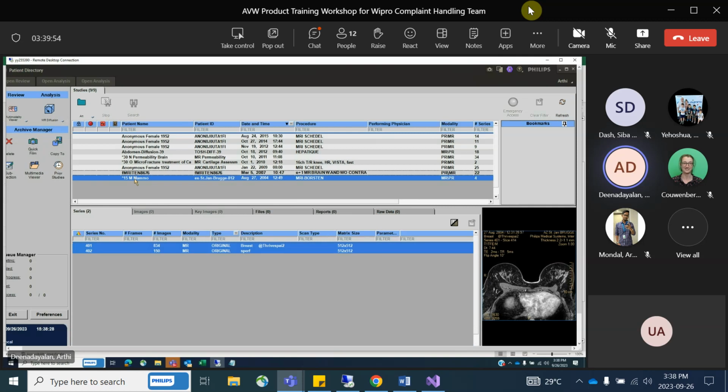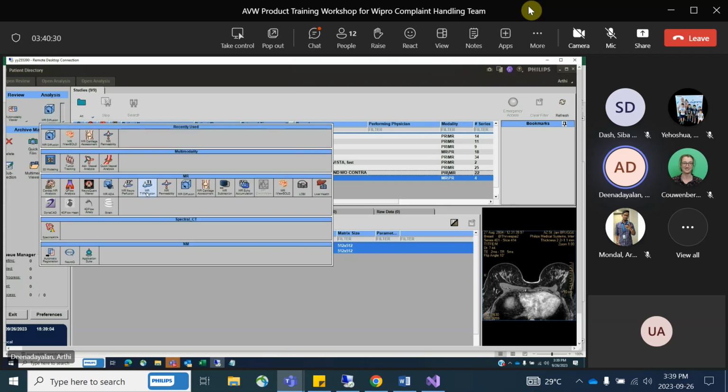I will tell about another application, which is the T1 perfusion application. So in general, the T1 perfusion application, usually we will handle the breast scans and the brain and the abdomen. But now I have a breast scan. So the T1 perfusion application, how do you load it and what do you in general see on the application? Basic functionality. So I have a data set already imported and kept. So select the data. In the analysis, similarly, select the drop down. You will see something called as MRT1 perfusion. Select the application.